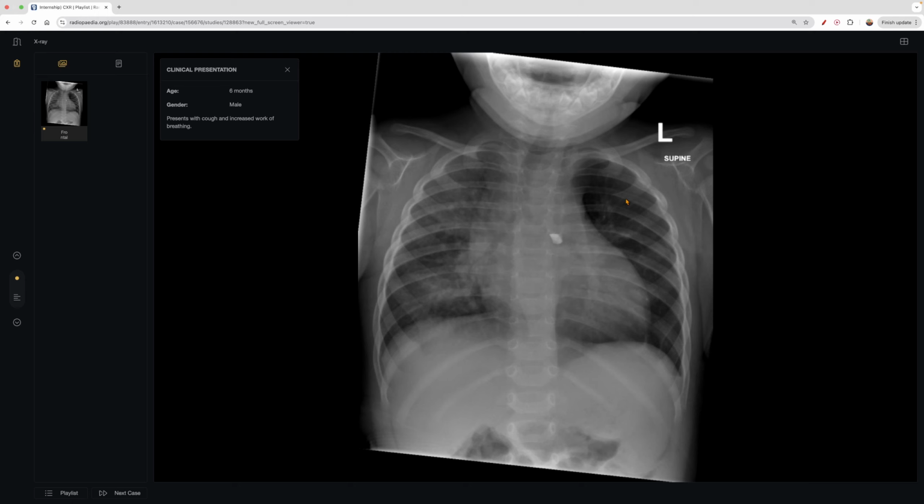And it's not a pneumothorax idea, but as in there's air kind of being trapped, almost like a sense of COPD, right? Instead of chronic obstructive pulmonary disease, is it acute obstructive pulmonary disease, in that all the air can come in because we have more muscle to inhale versus exhale, where we rely on that passive recoil, right? And so you can see the lucency of this lung versus this side here. It actually looks a little bit more potentially crowded, perhaps. Nonetheless, it's fine, but it definitely does not look as lucent as the other side.